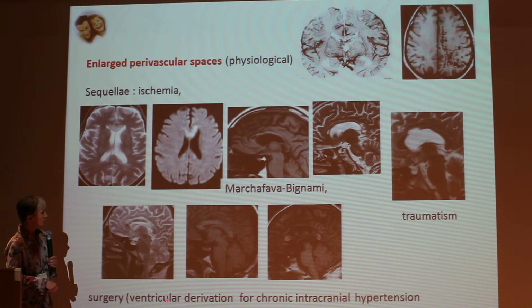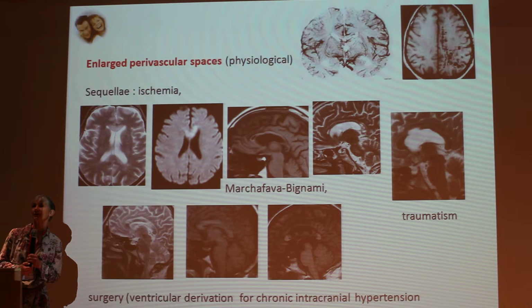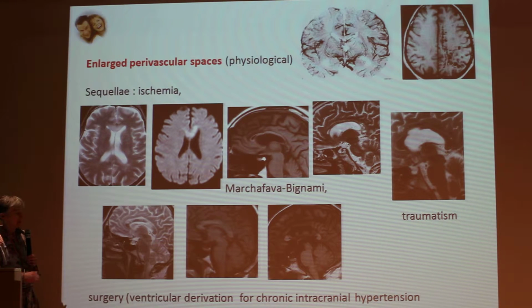And also, and this is a very specific image, that's why I showed this image to you.